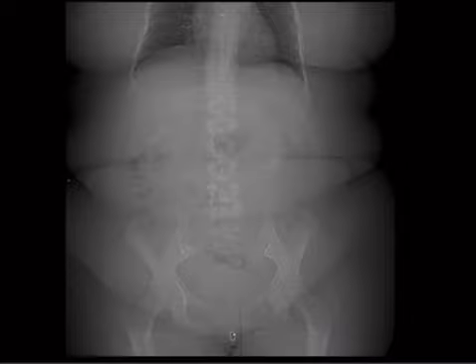So 2 critical findings on this examination here. This one and that one. Don't want to miss the median sternotomy in this case. Yes, the sternotomy wire is intact.